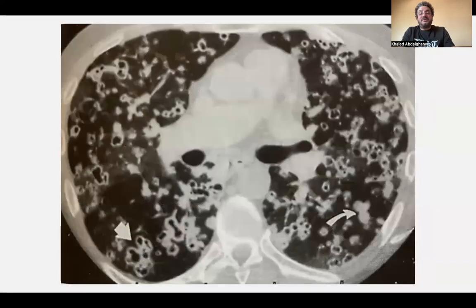Based on the axial distribution, here we have basal nodules cavitating on the pleura. This is the random distribution of cavitating nodules. The randomly distributed nodules with or without cavitation will highlight metastasis as a differential diagnosis. And PLCH is not, because of the centrilobular location of the nodules or cavitations.